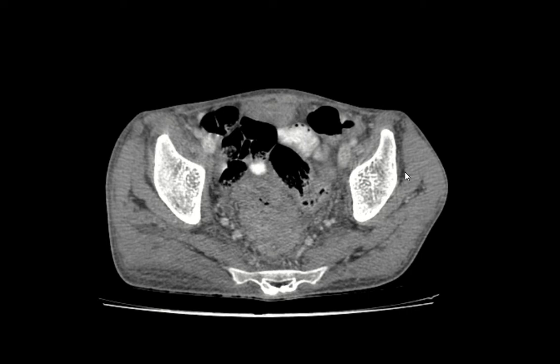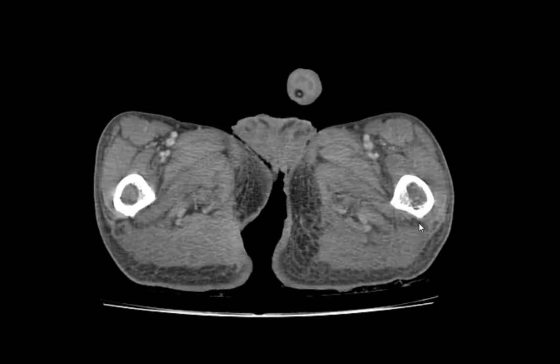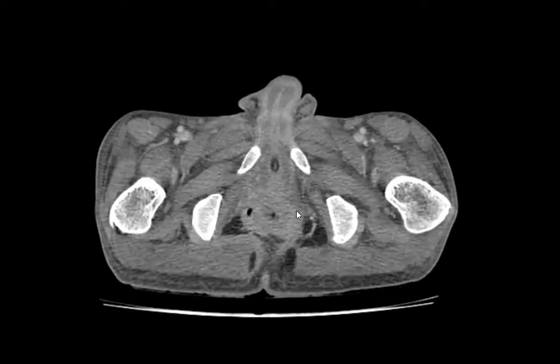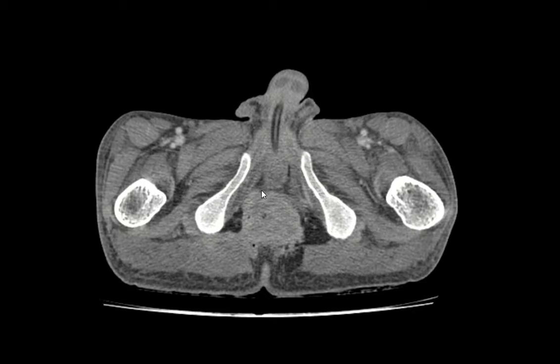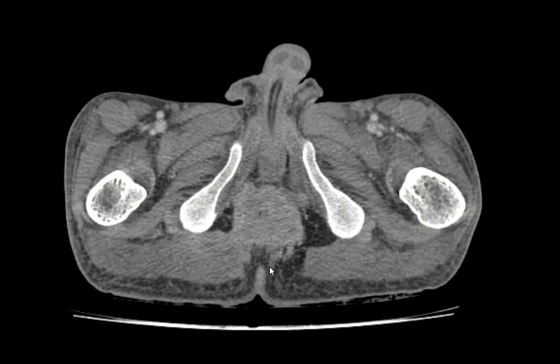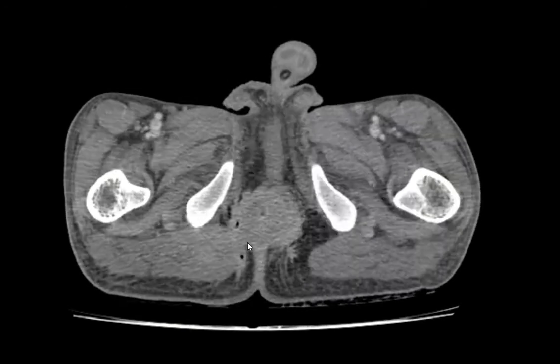All right. So this patient presented with a wound around the rectum. What we basically have here, when we start to trace from the anal canal upward into the rectum, we see there is a lot of hypodensity around it and fat stranding around it, and it is also involving the gluteus muscles on the right side, and there are focal air foci inside them suggestive of an abscess.